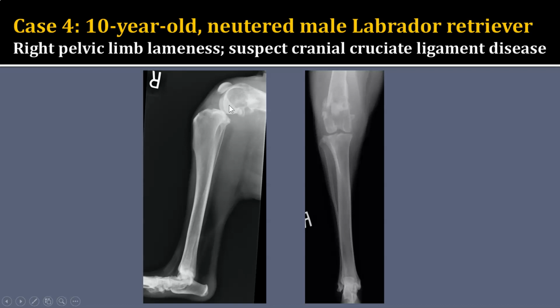When I look at the articulation of the stifle and I look at the patella and the tibia and the fibula, I do not see any other osseous lesions, and going down the leg, they look okay as well. So what I am identifying is an aggressive looking lesion. That is because of the pattern of lysis, the cortical lysis, the pattern of periosteal reaction, and the indistinctness of the lesion. So an aggressive lesion that is in only one bone. It's in that distal femoral metaphysis.